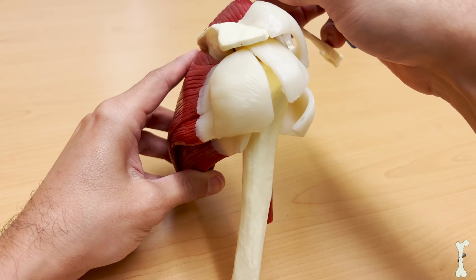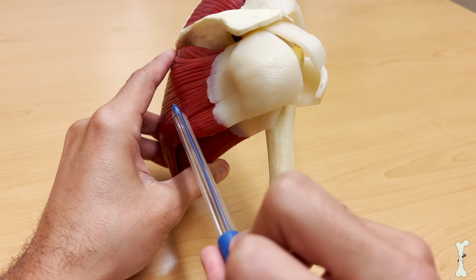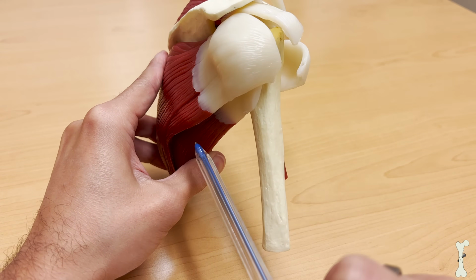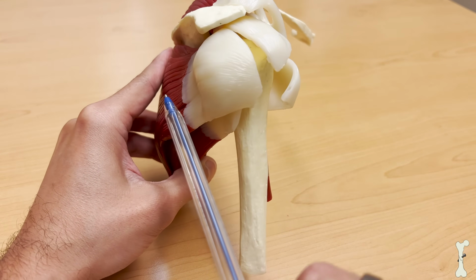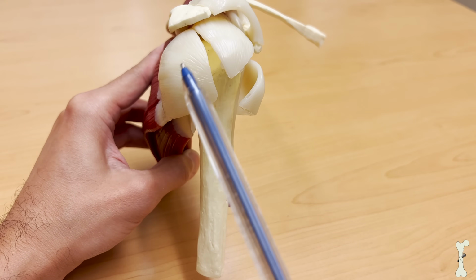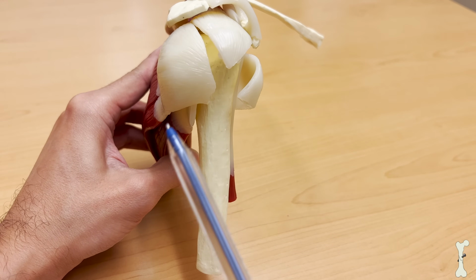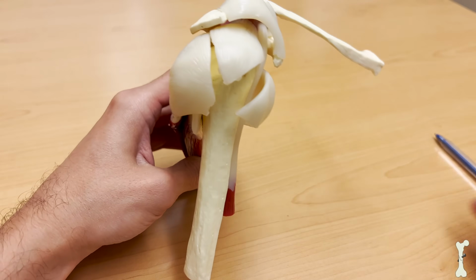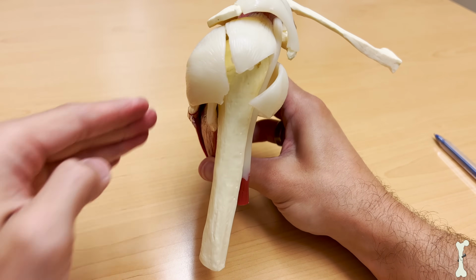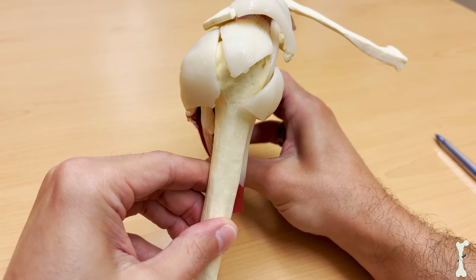The last two rotator cuff muscles attach along the back of the shoulder blade, right here, the infraspinatus and the teres minor. And these extend back out towards the camera again and attach along the top and sort of the back part of the shoulder for the infraspinatus, and the teres minor attaches more along the back of the arm bone. And so if we think about moving deeper into the shoulder, we'll see the humerus here.